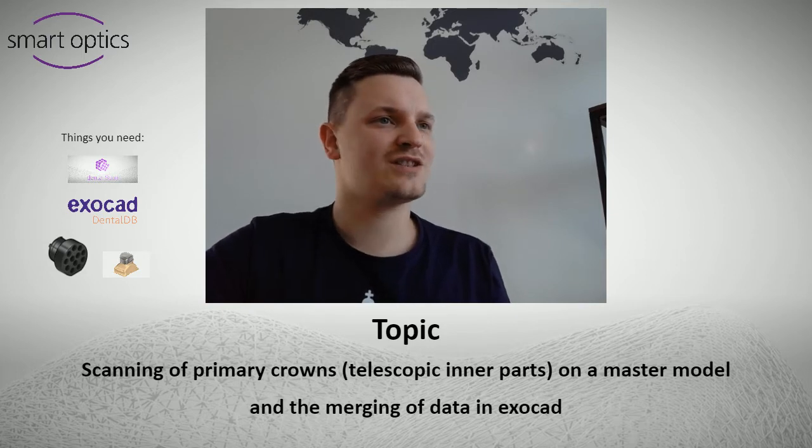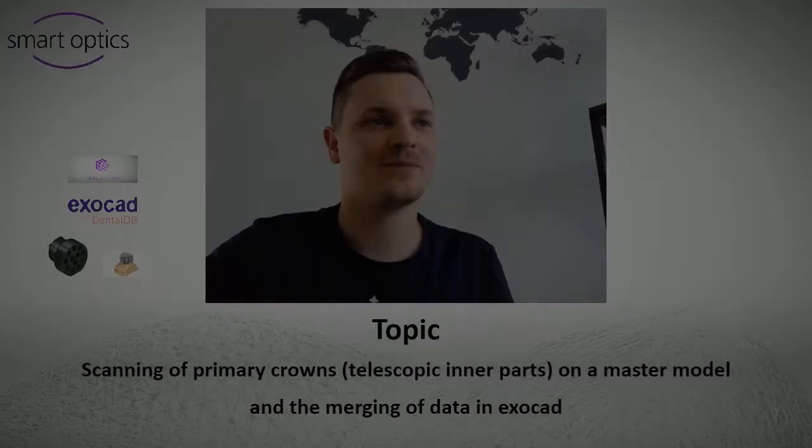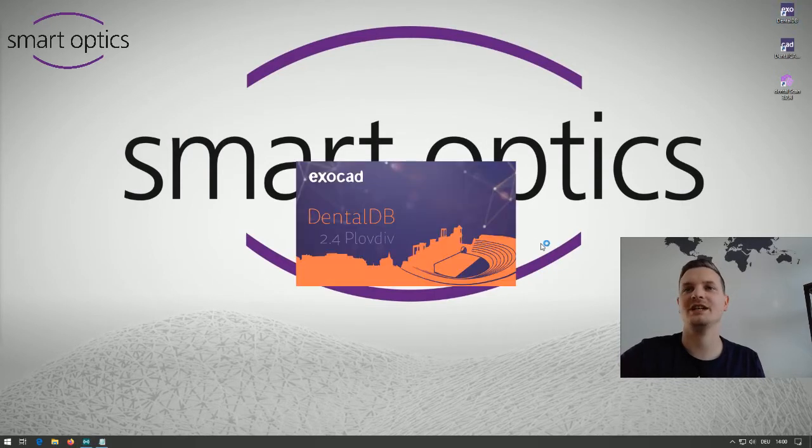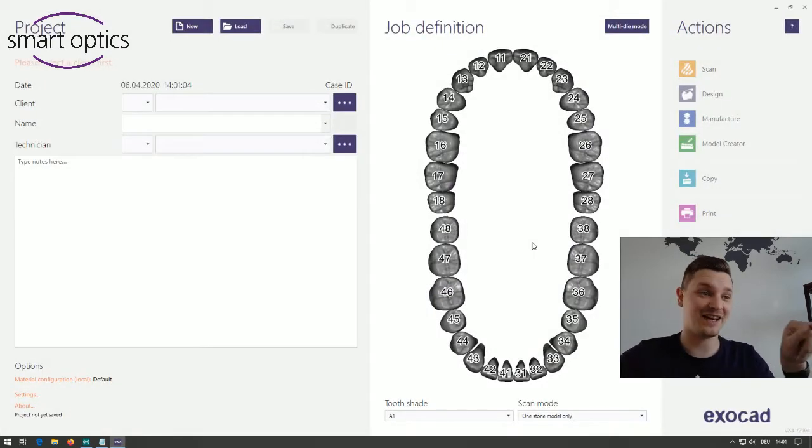So first of all we will start with starting exocad. I just start the Dental DB. Keep in mind that Carsten is always in the stream and will react on your comments if you have questions or anything like that.